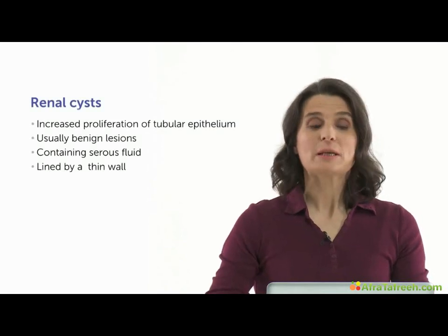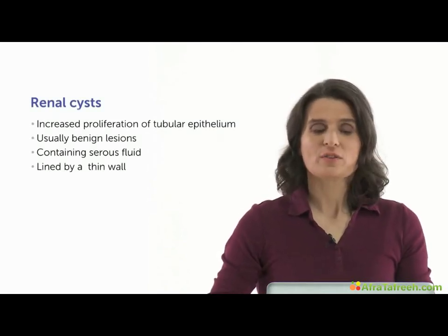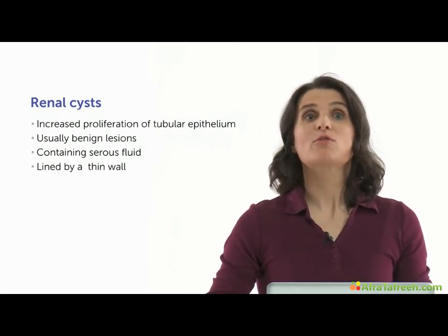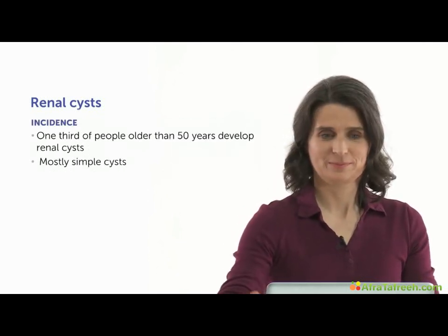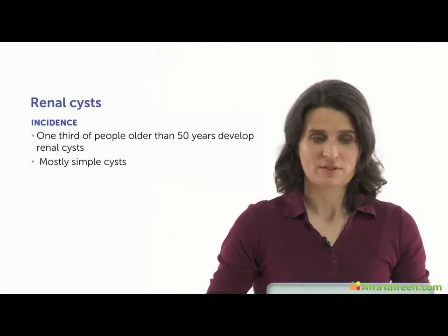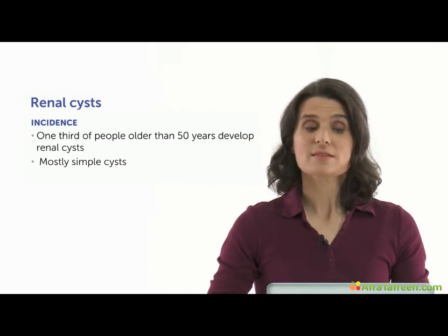Another pathology we encounter quite frequently are renal cysts. They are usually benign lesions, contain serous fluid, and are lined by a thin wall of epithelium. About 1/3 of people older than 50 years can develop renal cysts. Most of them are simple cysts.